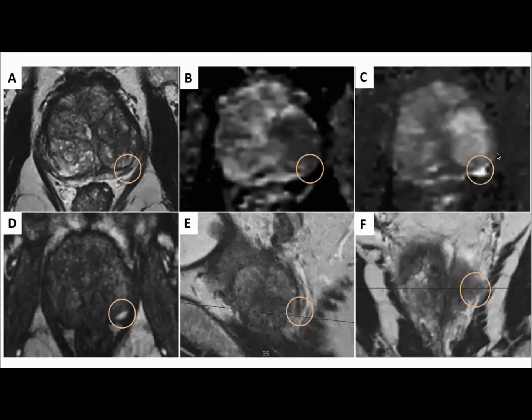This is definitely characterized as a category 4 lesion, because the size, I cannot take the size, but it is less than 15 millimeters. So it went from category 3 to 4 with the help of the contrast enhanced sequence. Yes, Dr. Ammar. Okay, thank you.